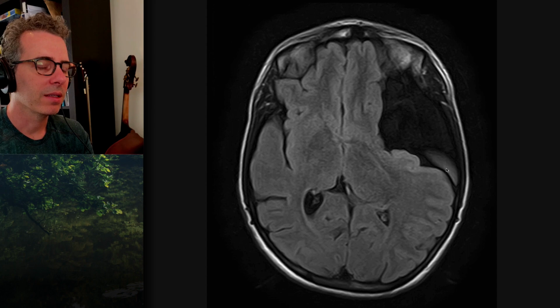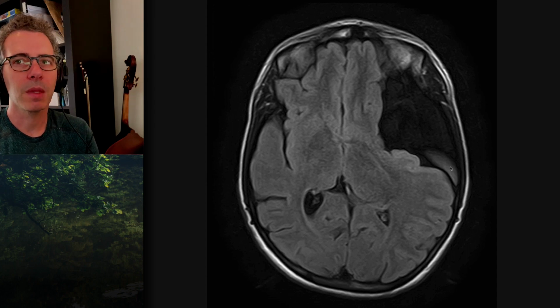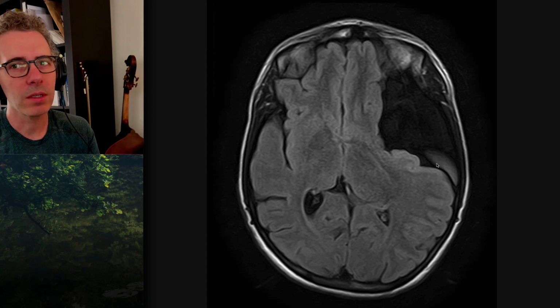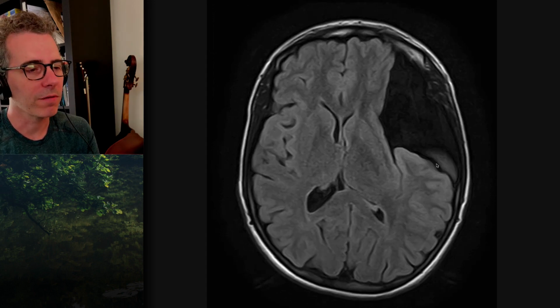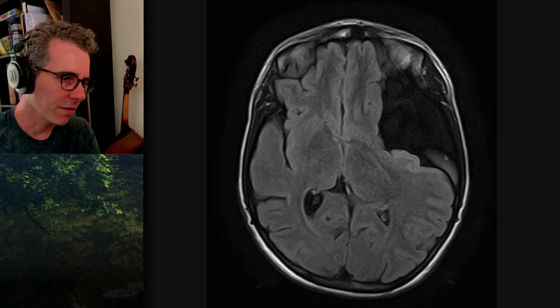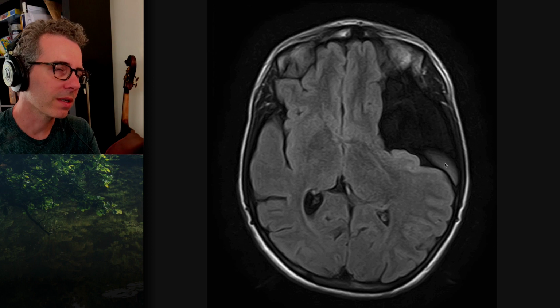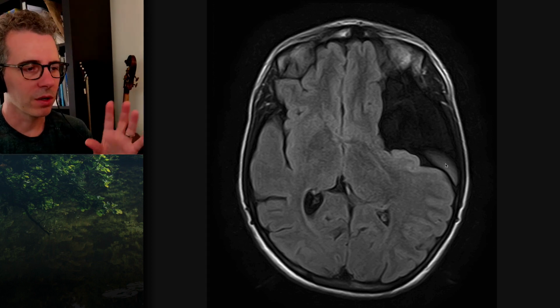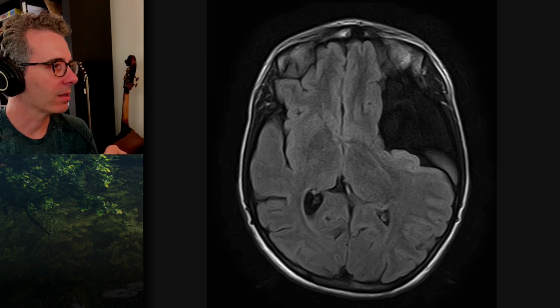Yeah. And the thing that distinguishes it from an epidermoid cyst, for example, is it's really smooth. You know, we saw an epidermoid last time, right? And it has that coarse, dirty, ugly-looking FLAIR lack of suppression. Whereas this is a really smooth, fluffy area that looks kind of like when you see slow motion of ink in water. You know, that sort of slowly flowing diffusion pattern.